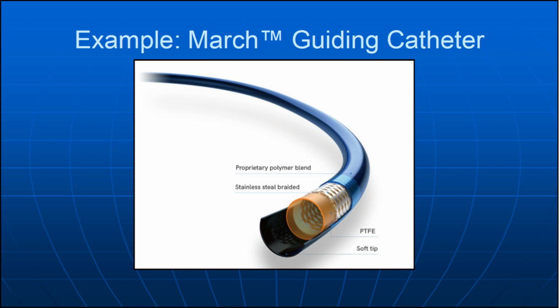The design shows a soft tip on the distal tip of the guide catheter. This soft tip is typically not modeled in the software, as it is usually very short in length.